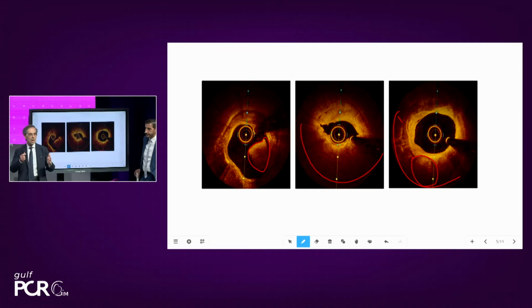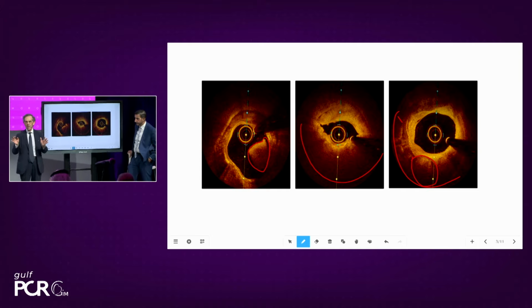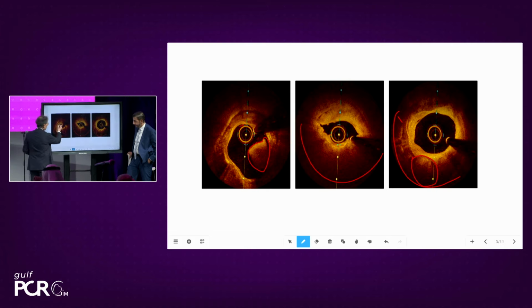The point is how I can detect the calcium, how I can detect thrombus, which one is which. We are talking about the practical things. We check first and say this is something that I do not like to have inside my vessel. This is a protrusion, it's clear. When you have the lumen depicted, the lumen is this one. Here you can see the white, bright light, because the light is based upon two things: the one that is coming back, that is backscattering, and the one that is not penetrated. Here you can see that the light is becoming damped, so it's becoming dark.